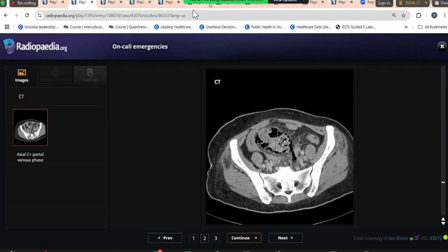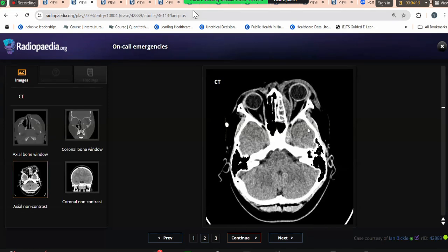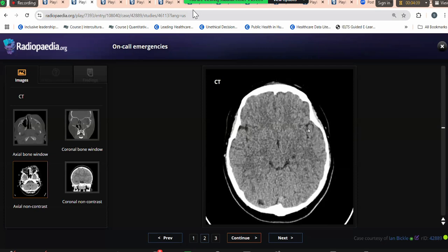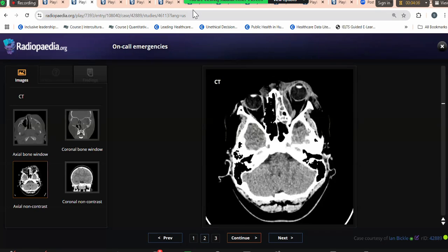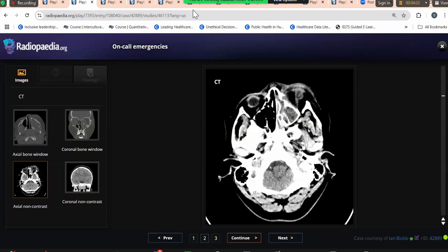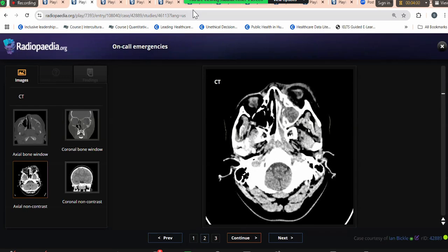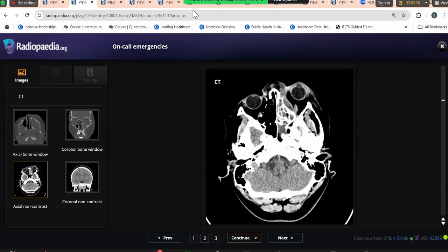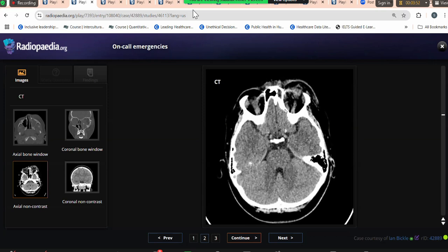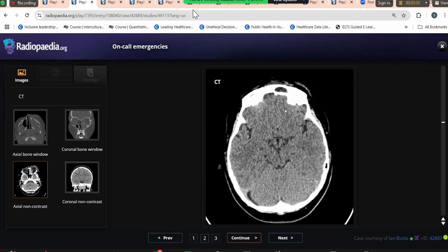Again, this case was very well done. I was happy that, again in this case, you said that we look at the bone windows. Although you were giving me findings on the soft tissue windows, saying that was very good. And you said that there is maxillary sinus, ethmoid sinus, destruction of lamina papyracea, subperiosteal abscess, and you went on to look at the orbital apex and the intracranial, which tells the examiner that you know what to look for when you see such a case.